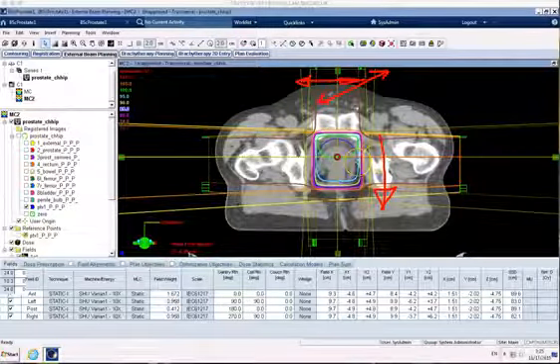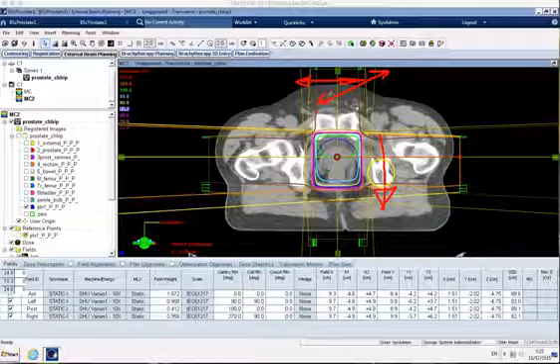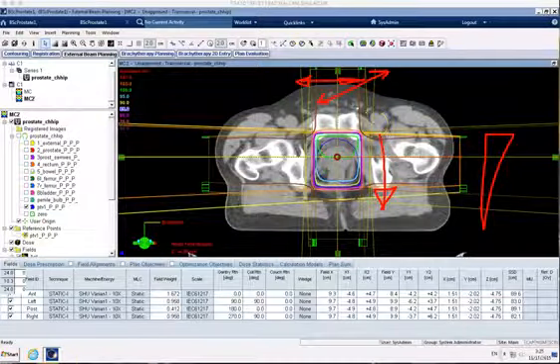So it's got to be on one of the lateral fields, or both of the lateral fields. If we're pushing it that way, what we want is a wedge that's thick end like that, pushing dose down. So let's add a wedge then.